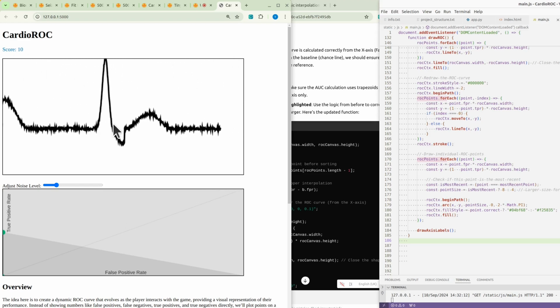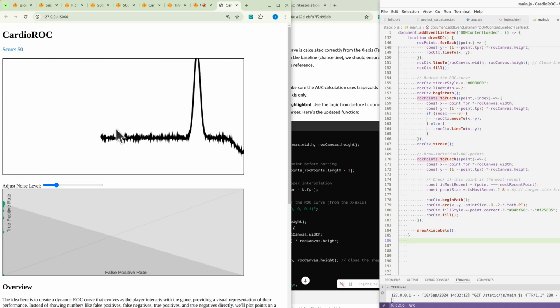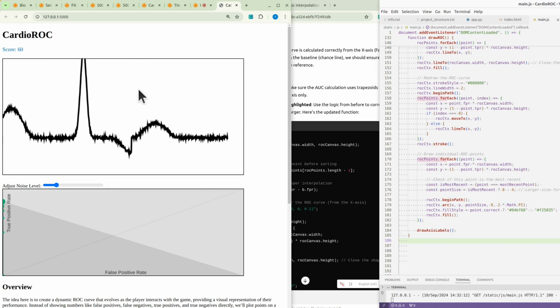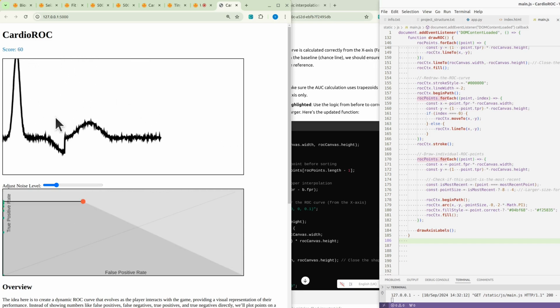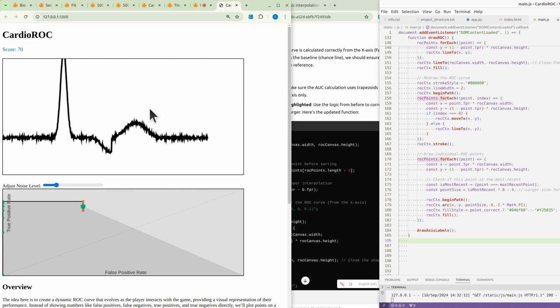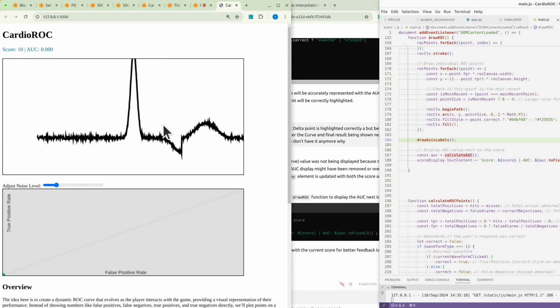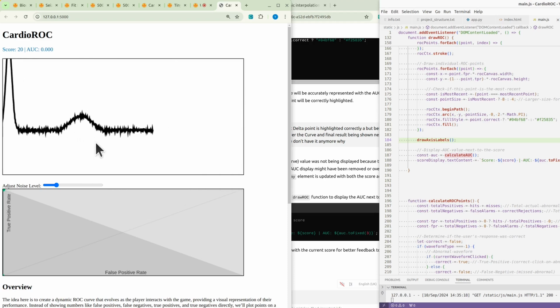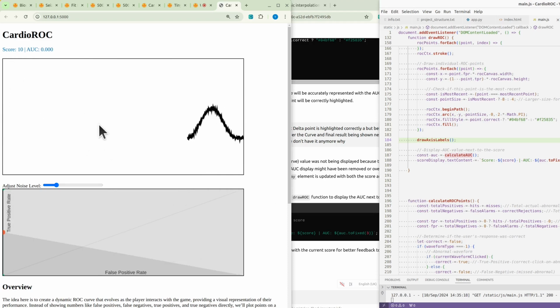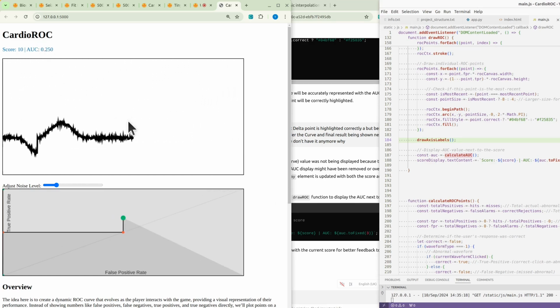The area under the curve cannot be calculated yet. That should be going a bit faster. Okay, so we are not clicking on that. We'll click on this one just so we can have the calculation. Okay, where's the calculation? Okay, so a green, we just go for red. Yep, and now we go for red. Yep, 0.25 is the area under the ROC curve.